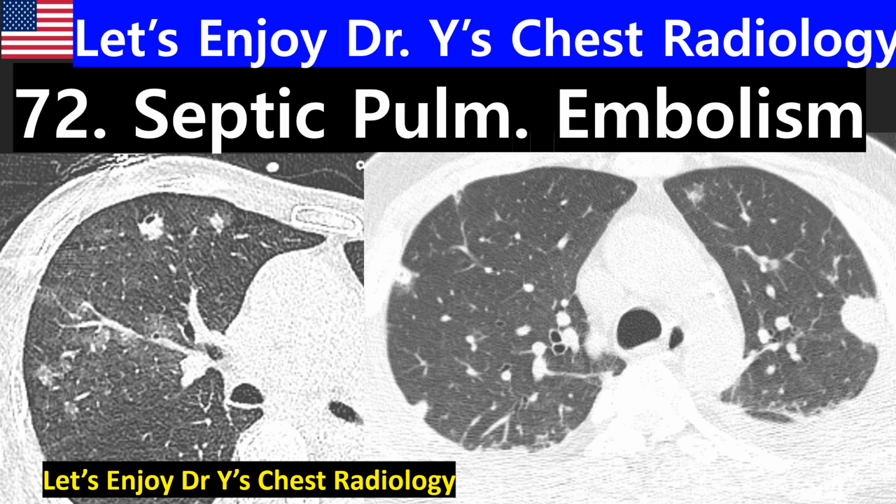Today we're going to talk about septic pulmonary embolism, radiologic findings of septic pulmonary embolism, chapter 72. We see two CAT scan images of septic lung emboli: variable-sized ill-defined nodules, some with cavity, some without cavity, and peripheral lower lobe dominance, some with pleural effusion.